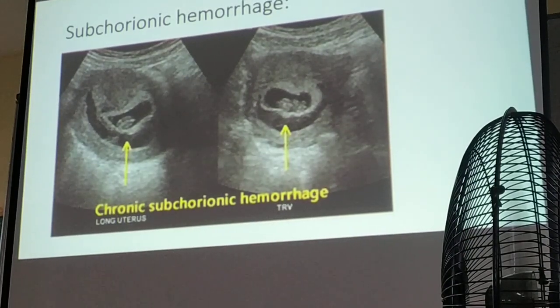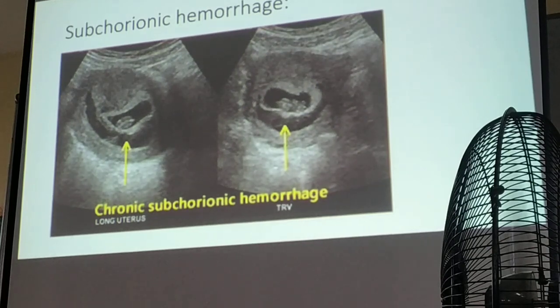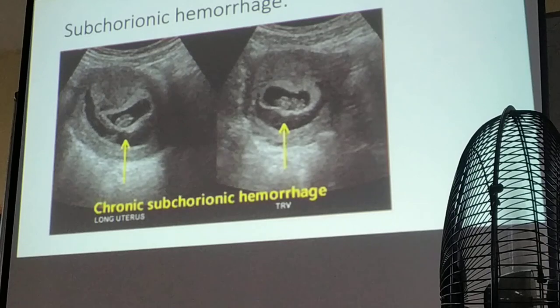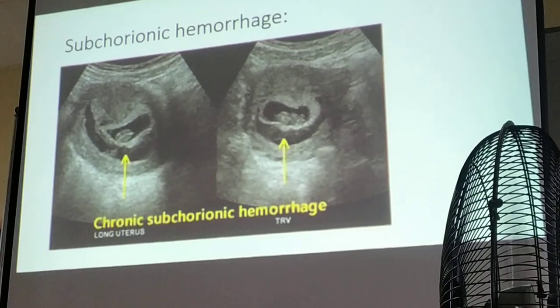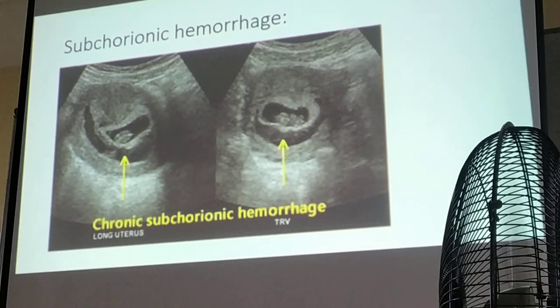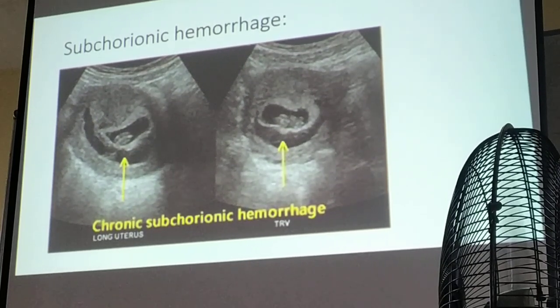Again, I would ask you the management for this slide. Management. Subchorionic hemorrhage. Complete bed rest. Okay?